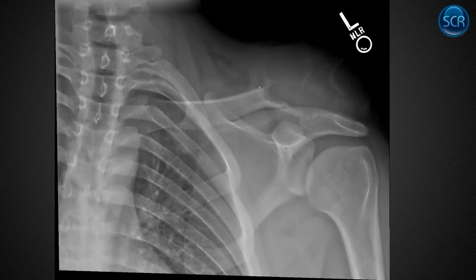What are we seeing in this one? This distal clavicle is missing too, isn't it? Is this osteolysis? Is this inflammatory joint disease? No. There's a big old expansile lytic lesion here. This looks like a giant bone aneurysm because it is. So this is an aneurysmal bone cyst.